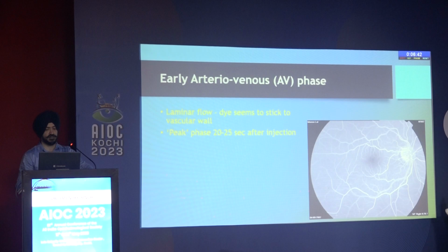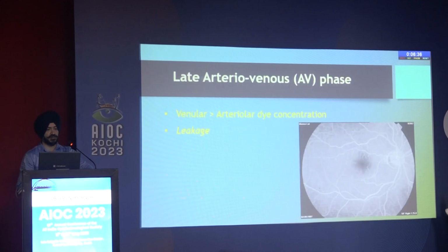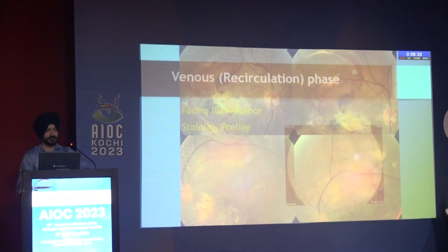The early phase and then the mid phase. Mid phase is the peak phase where we read all the capillary dropout areas. In the late AV phases, we read the leakage. In the venous phase, we look for staining and pooling.